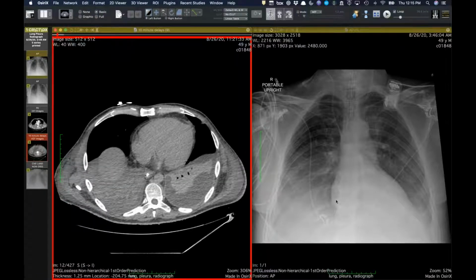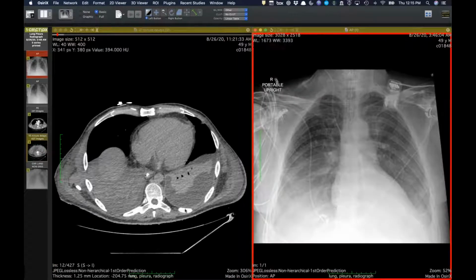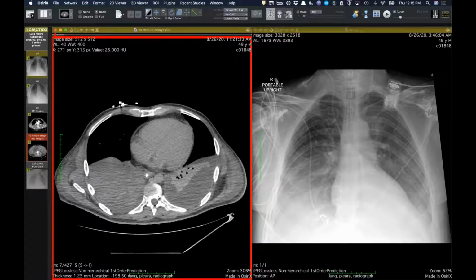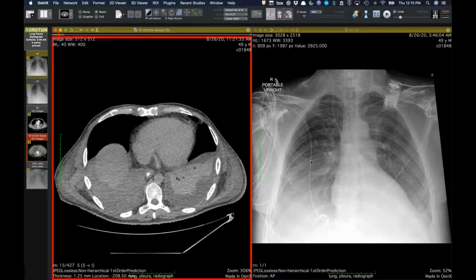But you can see the enhancement of the atelectatic left lung, and then the socked-in presumed pneumonia in the right lower lobe. And Travis, I think it also illustrates the point that radiography can't distinguish pleural fluid from consolidated lung. It's just white. Right. So I thought this was a pretty cool example of this, and why my practice, and how I was trained, is always to undercall effusions, or don't assume that just because you have this kind of hazy gradient that it is effusion.